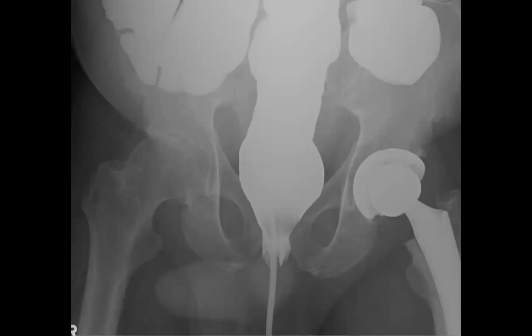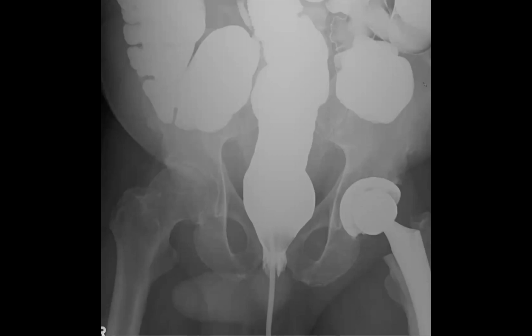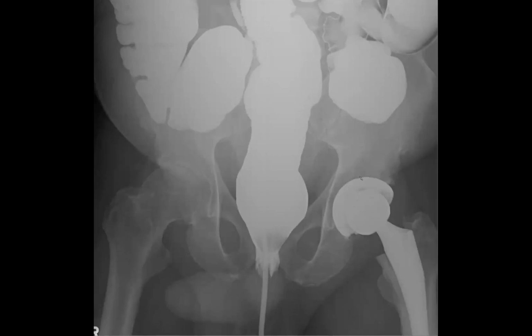I never knew that was the term for a gastrografin enema, but they said do a GGE. So we did a gastrografin enema and it was completely normal. So that was just decompressed sigmoid colon. I think the rest of it, they had a hip replacement, so all the colon was distended from ileus. So if you get those pseudo-mass transitions, and you can't get a colonoscopy or you don't want to, go for a gastrografin enema, and that can answer your question.